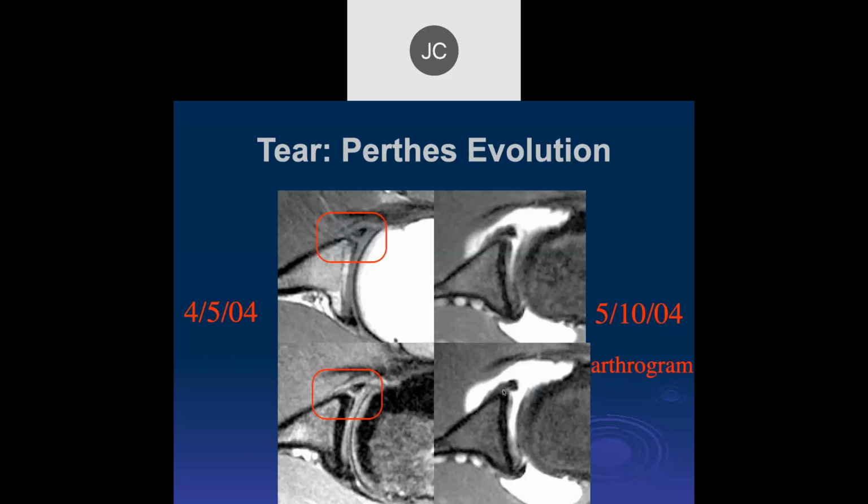So when we say you see a thickened tendon or ligament, or in this case periosteal attachment, and it's thickened compounded with an old injury, that old may not be that old. This healing effect occurs pretty rapidly, but we can see marked thickening just in a 5-week time period.